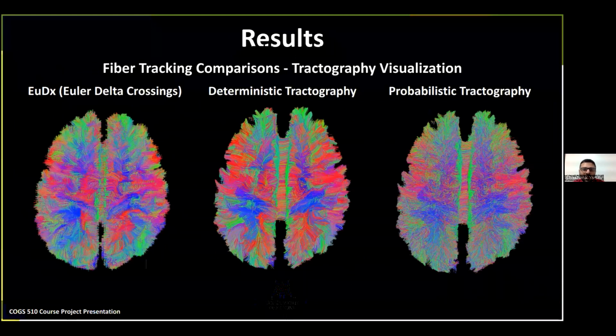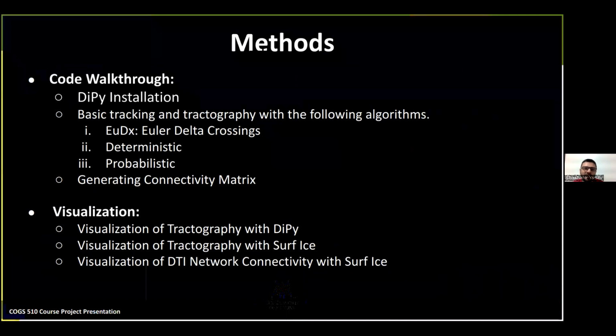Before going to results, we'll talk about these results, but I would like to stay on this slide for some time and go through the code first. I put all the code on my GitHub. Here's my GitHub. I've put the link somewhere in one of the slides at the end, and then we'll go through all the GitHub notebooks here.